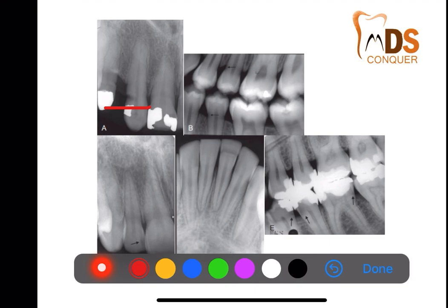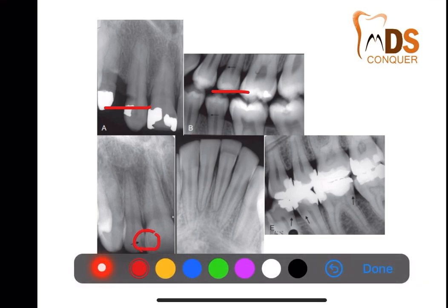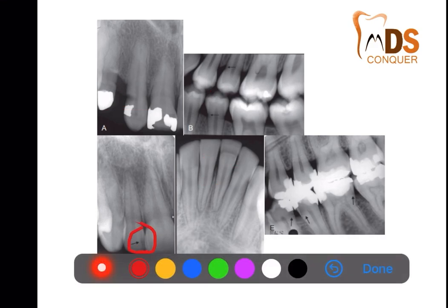Caries will usually be a little haphazard, not well defined, whereas cervical burnout is usually well defined, and you can easily make out that it's cervical burnout, which is because of more X-ray penetration in that area. Because of the invagination of the proximal root surfaces, more X-rays pass through that area, giving the radiolucent appearance. At times you can even find such findings, right? Here you can see a radiolucent band. This is enamel hypoplasia, and in this radiograph there is a small radiolucent line which mimics caries, but it is not caries.